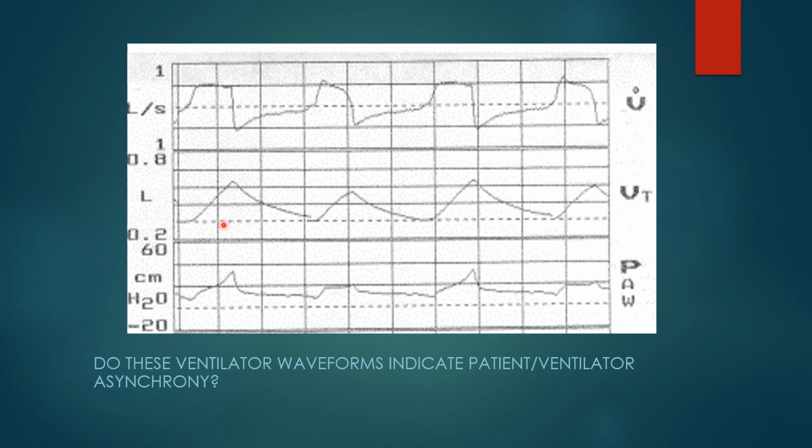You also see on the pressure curve, the patient is trying to exhale before inspiration ends. So this last part of inspiration, he is trying to exhale and it's pushing that pressure up. So the pressure is climbing and then it climbs more steeply.